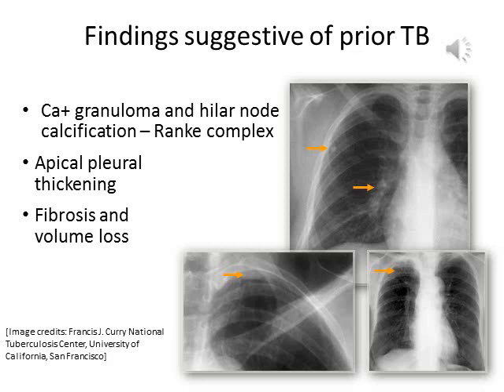It is also possible to see radiographic findings as a result of prior active tuberculosis disease, namely sequelae of the earlier tuberculosis disease. We have to note that age and activity of the disease cannot be determined by a single chest X-ray.